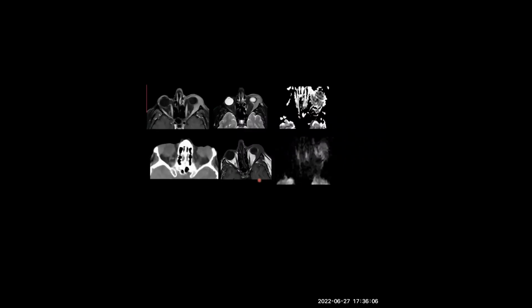You will find this in the CT because it is cellular, so it is a bit different from the common presentation of lymphoma. Here in the diffusion there is some diffusion restriction, and you see the foci, this area of low ADC value.